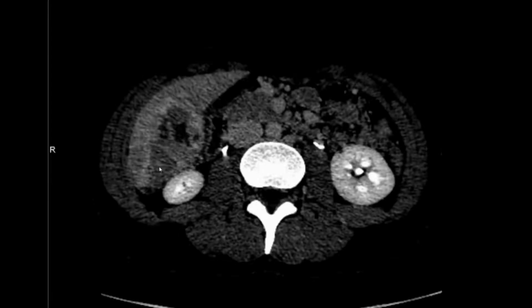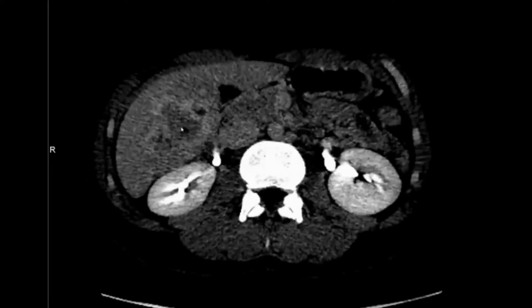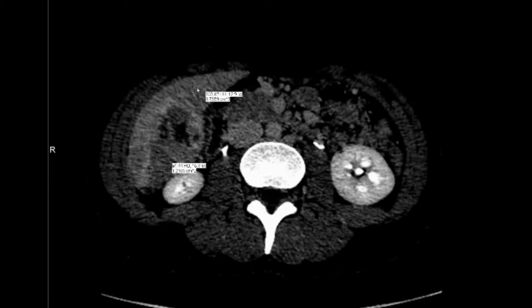Some tumors take a little bit longer to get rid of the contrast from their leaky arteries, and that's why it's important to review both the delayed and portal venous phases, especially when you're evaluating for HCC in a patient with cirrhosis who doesn't have a known tumor. Even if there's not arterial enhancement, if you see washout on portal venous phase or delayed phase, then it's going to be worrisome for an HCC. Depending on the size, I could put it at LI-RADS 4, I believe. So this has a pseudocapsule as shown here, and another illustration of washout where it's 103 versus 91 there.